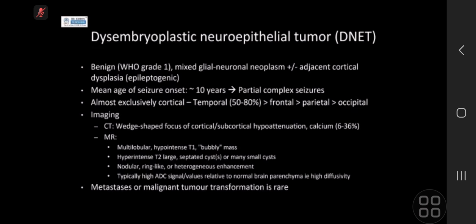I always thought those were more... Is it? Yeah, okay, astrocytoma, yes. I call it PXA if I'm not wrong. And that's often one of the ones with a cystic tumor with a solid enhancing mural nodule, which is one of the things I think of, which I don't see here. Okay, so this is a DNET.